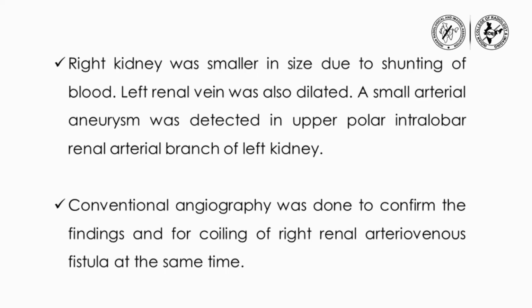Left renal vein was also dilated. And as I mentioned, a small arterial aneurysm was detected in upper polar intralobar renal arterial branch of left kidney. Conventional angiography was done to confirm the findings and for coiling of right renal arteriovenous fistula at the same time.